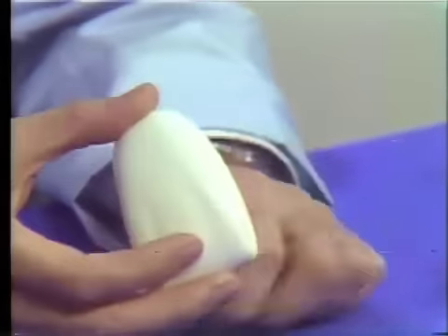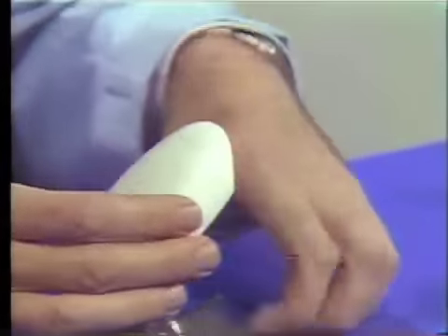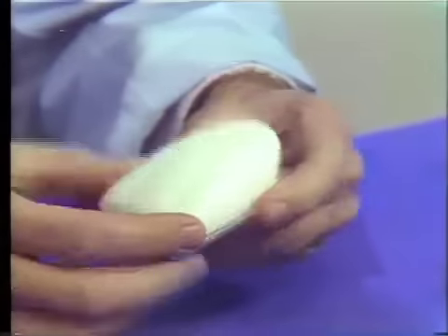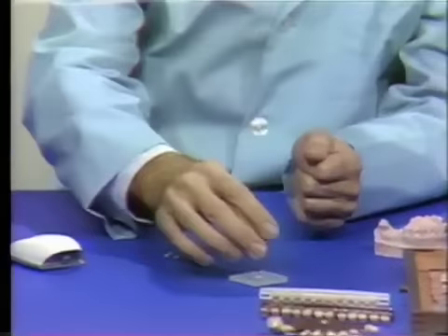The facing itself can be ground on the incisal, on the proximals here, and on the labial to contour it and so on. And the backing is then trimmed to exactly match the facing round here after that's done. The one area that cannot be ground, of course, is this fitting surface here, which goes against the Steele's backing. Now, here is an actual Steele's backing.